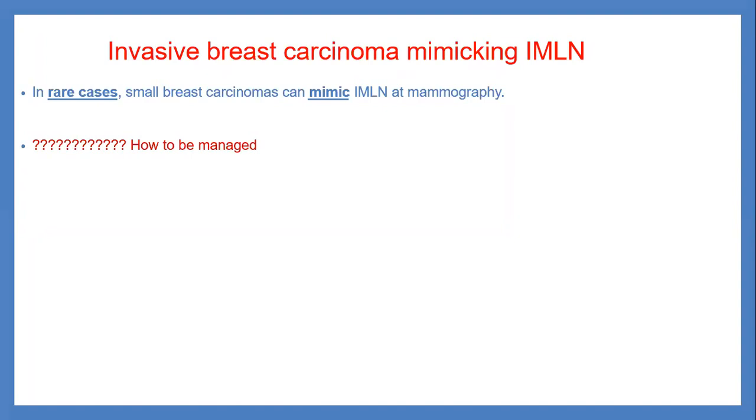I will put the patient on short-term follow-up. Short-term follow-up. So it depends. If the nodule is associated with suspicious findings, as you mentioned, yeah, then you will go for biopsy. If no, you will go for short-term follow-up. You will put it as BI-RADS 3.